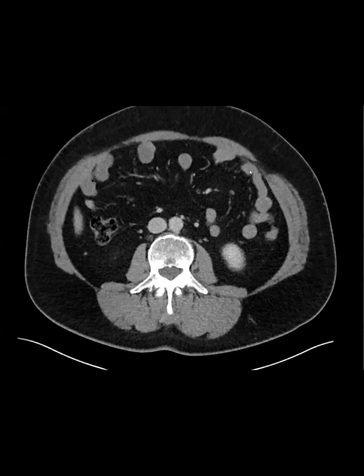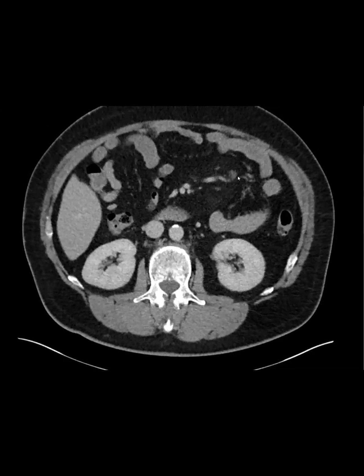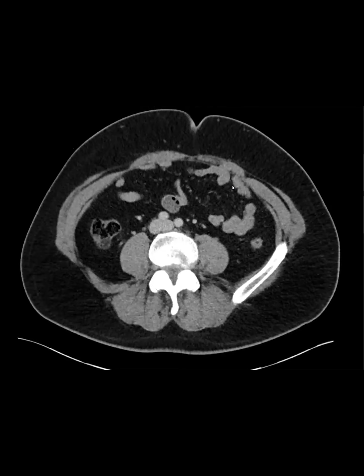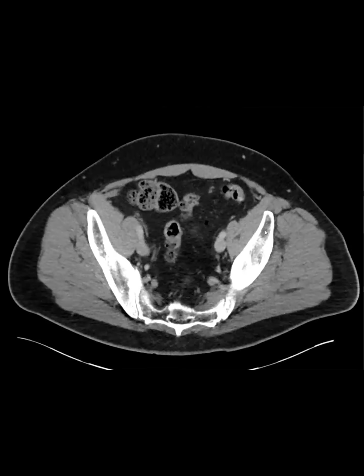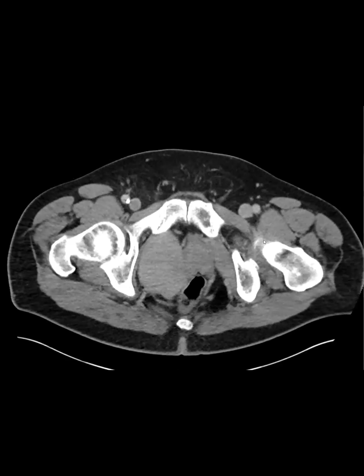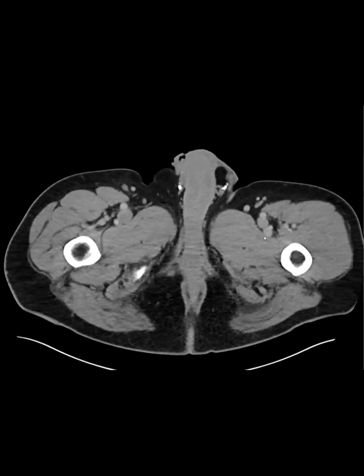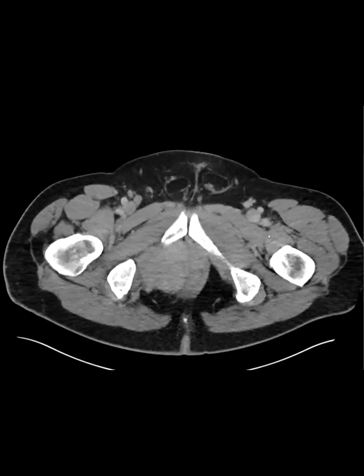Okay, this is my first case. It's a young male patient who was having right lower extremity swelling. So what do you guys see or think?